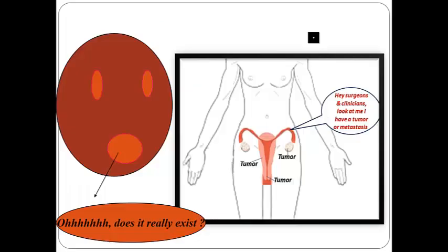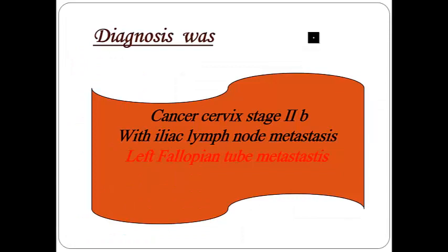The fallopian tube is usually a missed organ of the genital organs. We don't look at it, although the fallopian tube may contain masses. What are the masses that may be seen in the fallopian tubes?